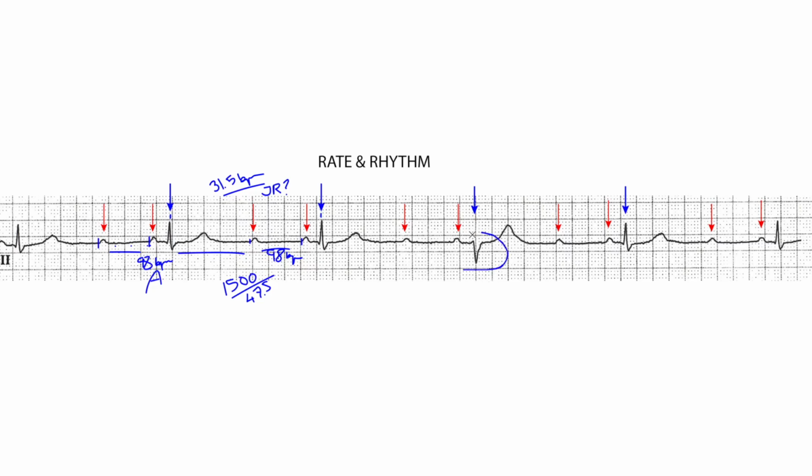Now this is interesting, and this I'm going to have to take a closer look at. So right now I'm suspecting that this is a block, and I'm suspecting that there should be a P wave buried in this T wave. There has to be, in order for this to be a straightforward block without something really extraordinary going on. So let's take a look at the 12 lead. Again, this is a single channel, right? If you have experience, you've already figured out what this is. But if not, then things get a little trickier.